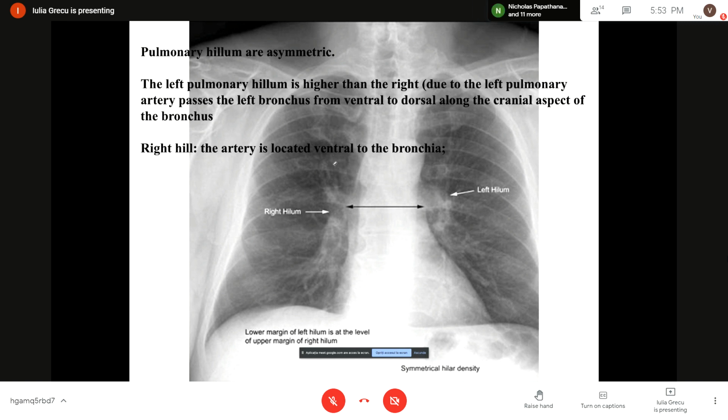This is a normal thing, and in the situation in which a patient is examined in upright position, in posterior anterior projection, if we start to see a lot of vascular marks in the apical regions of the lungs, then we should think there is a slight problem. So this is a normal aspect, with the markings more prominent at the base of the lungs, under the hilum.